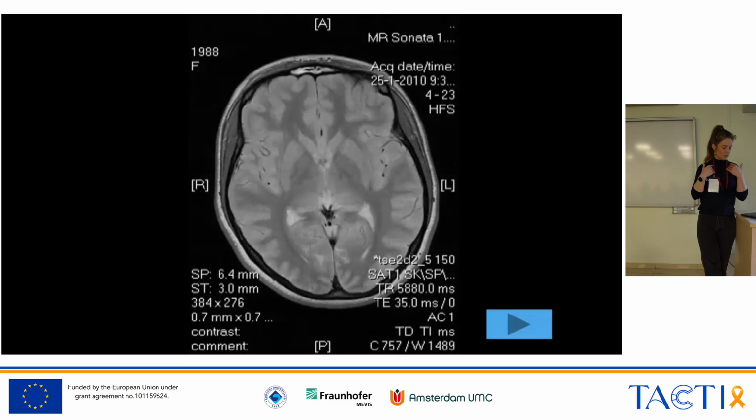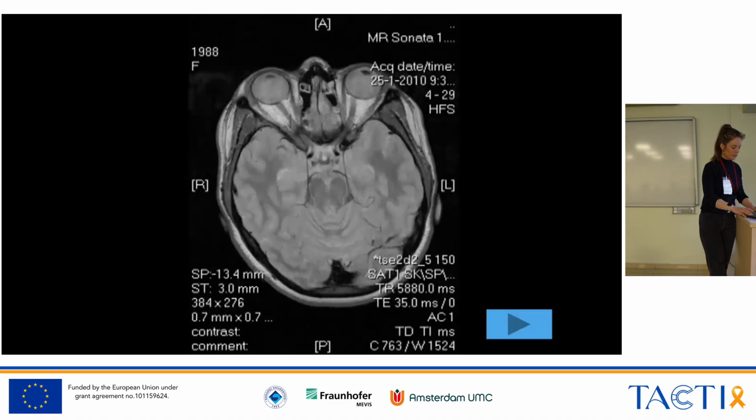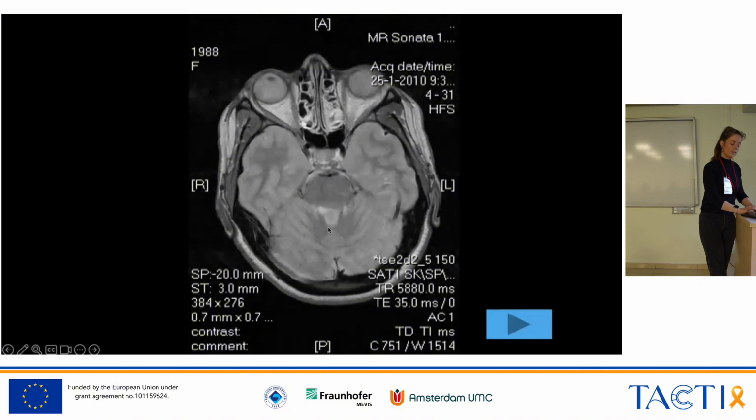Yeah. But luckily for us, it was a little bit easier. We had also the lesion here that I think you could easily overlook. And which then is in the same location type, actually. Yeah, that's true. It's the same location type, but this one isn't. Yeah. So this is the infratentorial lesion.